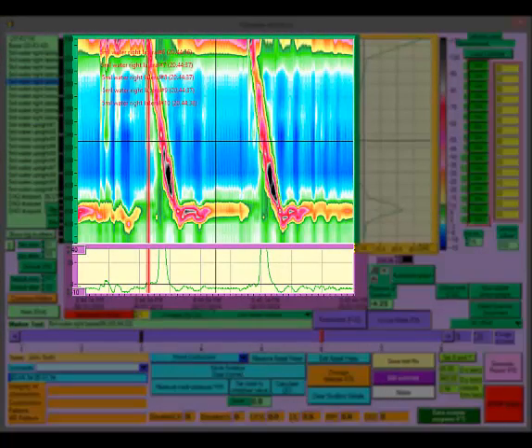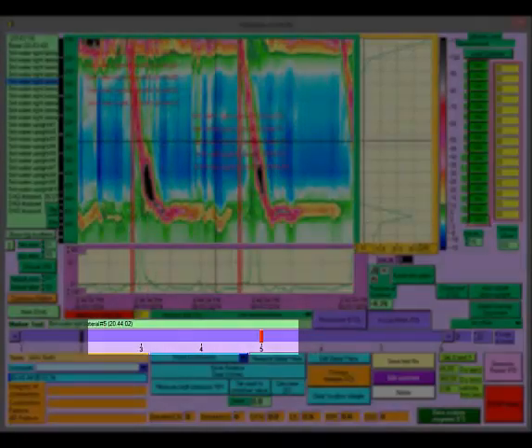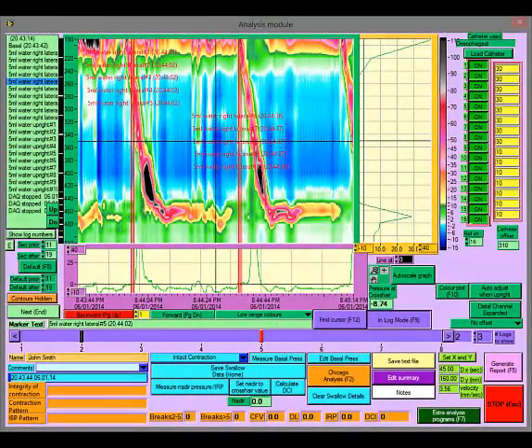You can modify the data displayed by adjusting the starting position and number of data logs to show. The period displayed is the data between the black and the red bars on the timeline. You can move along the timeline by moving the black bar. The red bar will follow at an appropriate distance. Alternatively, if you click on the timeline, the black bar will move to that position.